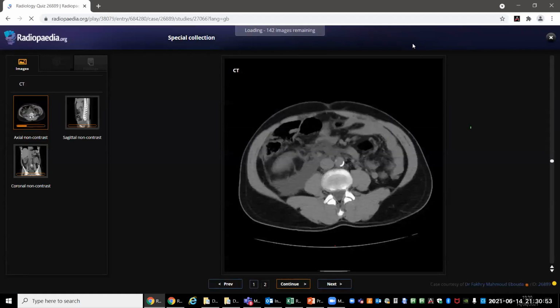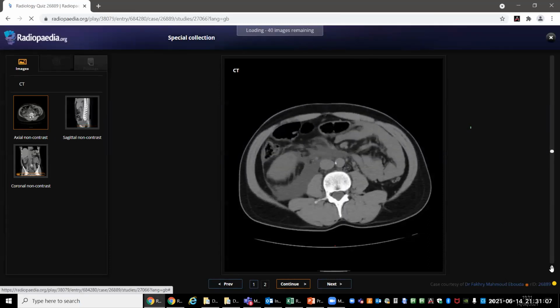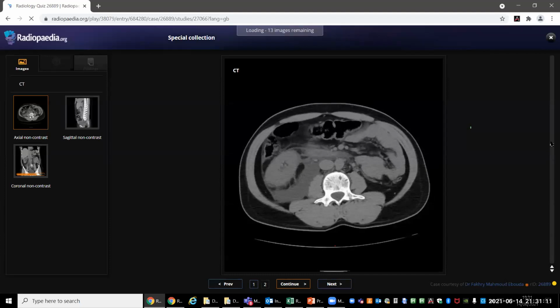So you need to have the control for this, Leila, right? Yes. Okay, I've given you control, so you have access to only the axial. Check your time to scroll through. Okay, I'll start from the beginning.